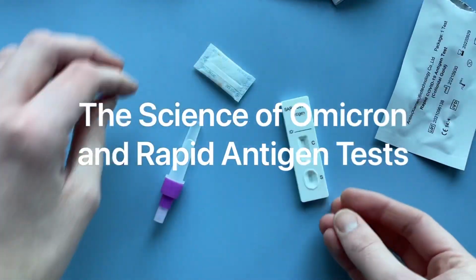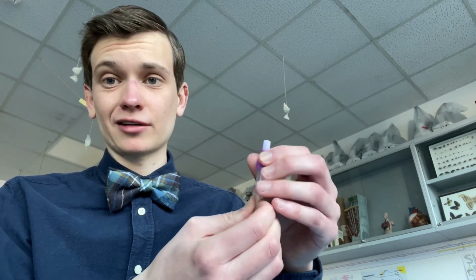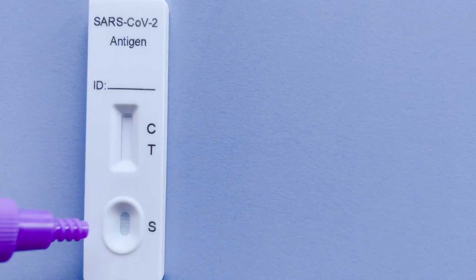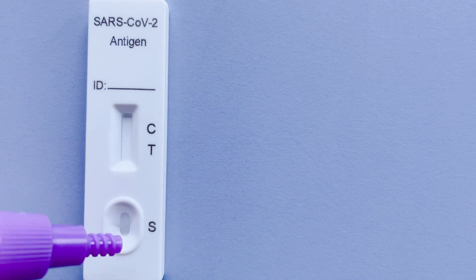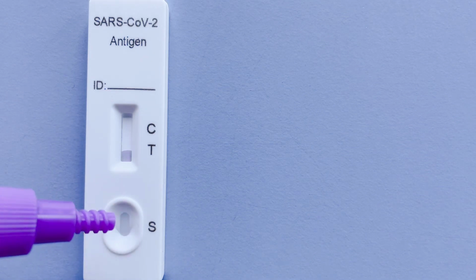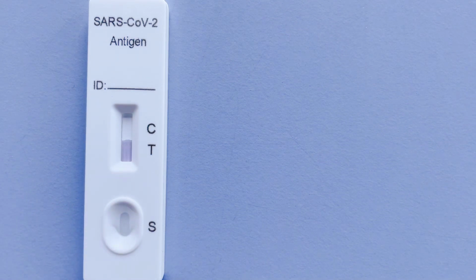So we've been using these rapid antigen tests a lot lately to see if we have COVID-19. But how do they actually work? So if my snot has coronavirus in it, then when I apply this solution to the test, it should register with 2 lines at the C and the T. If I don't have corona, and if I have a negative result, then I should only have a line at the C line.